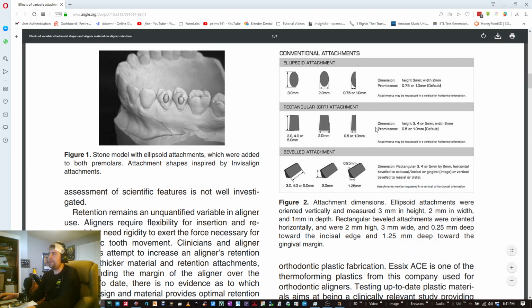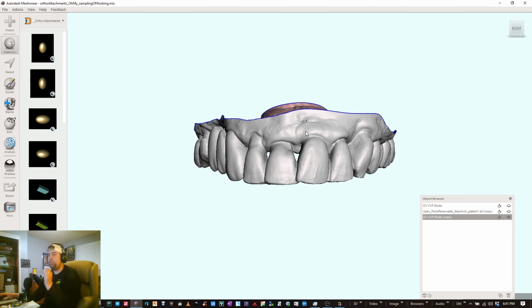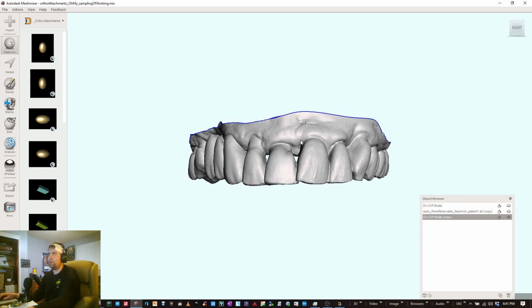And you'll see here in just a second, the dimensions I put in when I made these don't really matter because when you add them to the model, at least at this point, I don't have it to where it will stay the exact dimension of the original part. So if this was 3 by 2 by 1, or whatever the case is, when I drag it onto here, it's not even close to that. I think if you adjust the size parameter to a certain value, you can get it down to the exact dimension that you wanted it to be. So I'll show you. We'll go with first an ovoid one here.